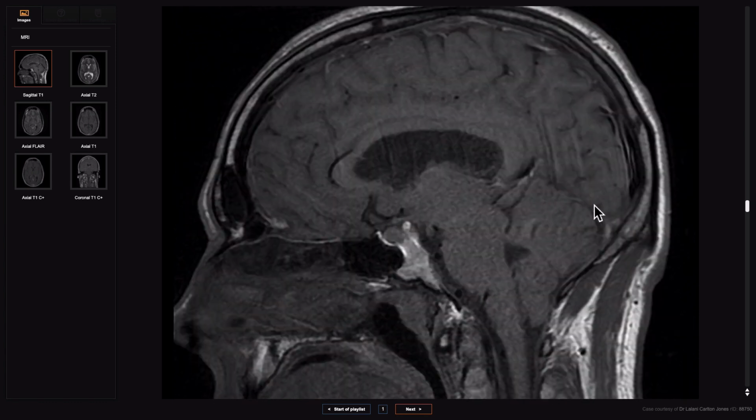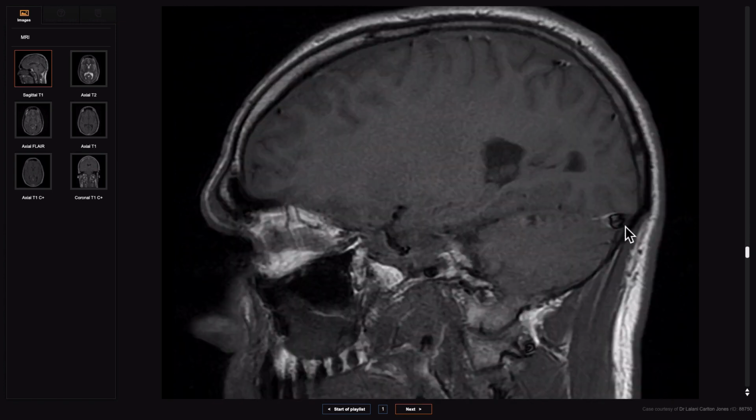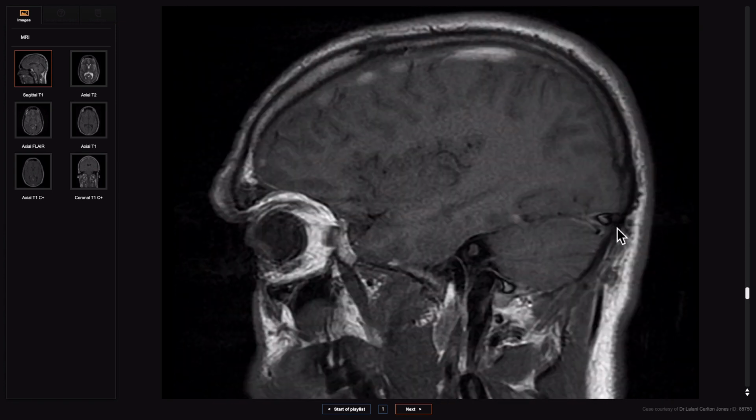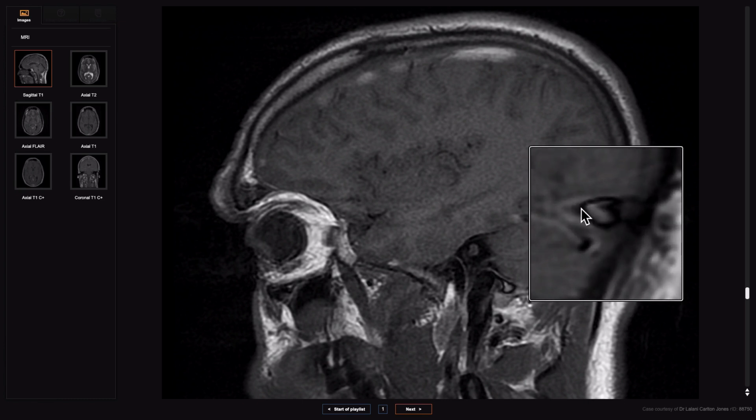Another feature in a CSF low volume state is that we get a compensatory expansion of the blood volume compartments, and we can see that manifest in a number of ways. The first is venous sinus distension. You can see this at a number of points. I like to look at the midpoint of the dominant transverse sinus. When we look here, we can see that the inferior border is downwardly convex, whereas it should normally be flat or even upwardly concave.